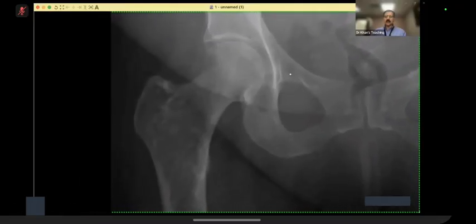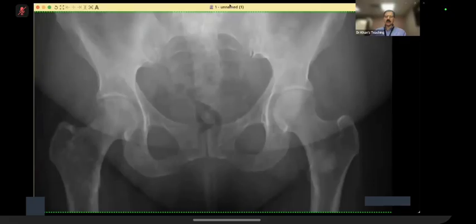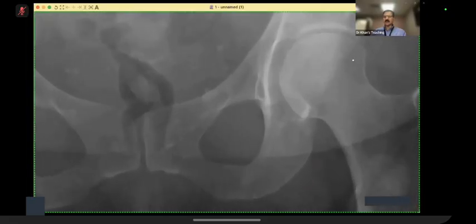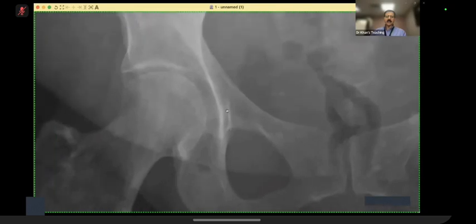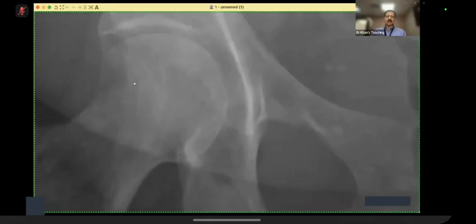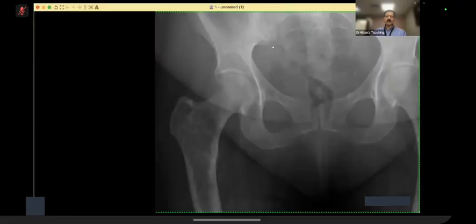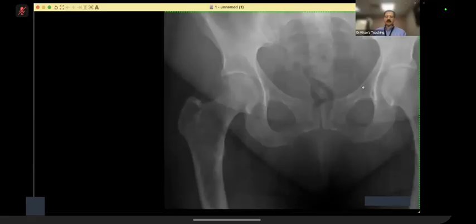Slight bit of expansion should not bother you. If you look carefully, let's see the trabeculae on the normal side, which is this one. Just concentrate here, and look at these trabeculae, concentrate in the subarticular region, just inferior to the joint. And you will agree that early coarsening of trabeculae can be seen extending all the way here. It's not all that fine. So, of course, this patient will develop more advanced Paget's disease in the coming years.